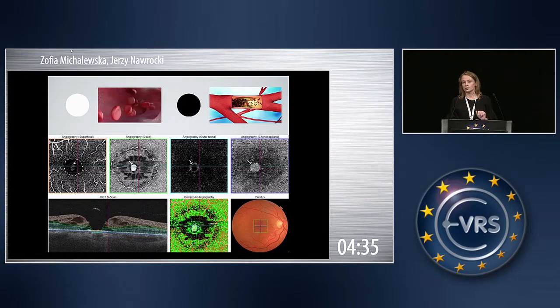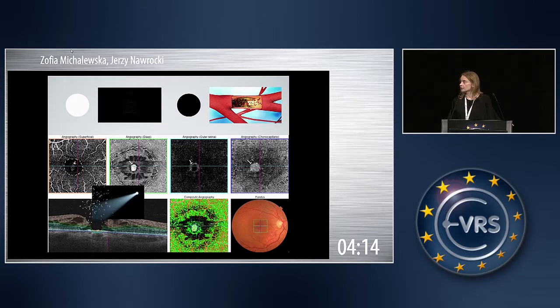If you look on Swept Source OCT angiography images, note that everything that is white means flow and everything black means no flow. But of course, if you look at the middle of those large macular holes, you can see a large white circle, which does not mean a lot of flow inside. It is an artifact. It might be caused by increased light transmission, or if you look at those white arrows, at a segmentation error.